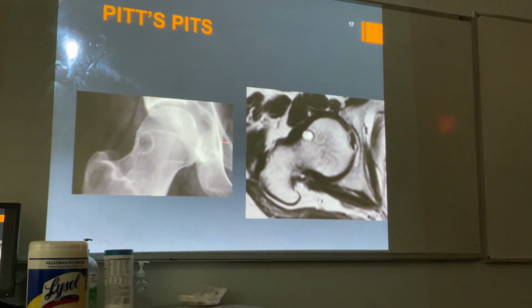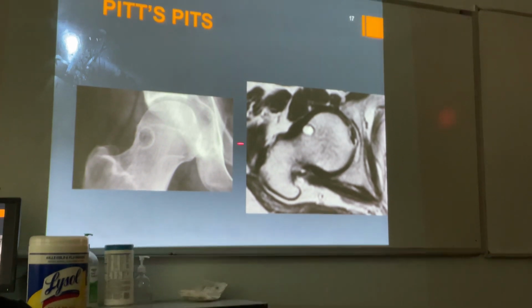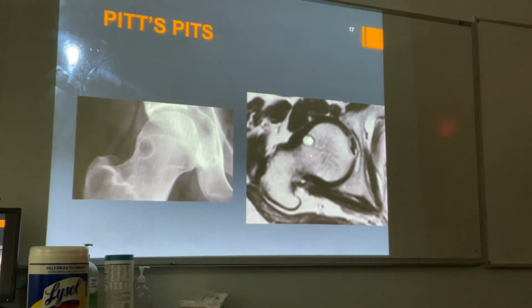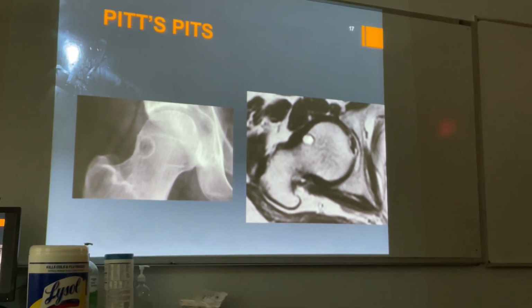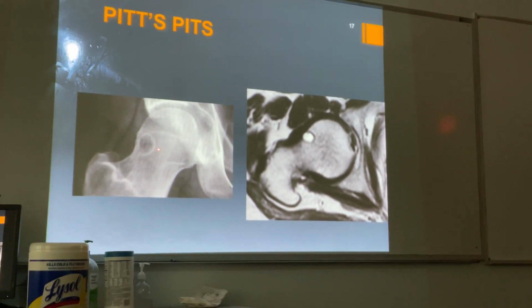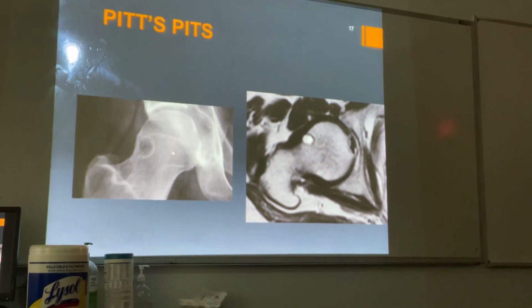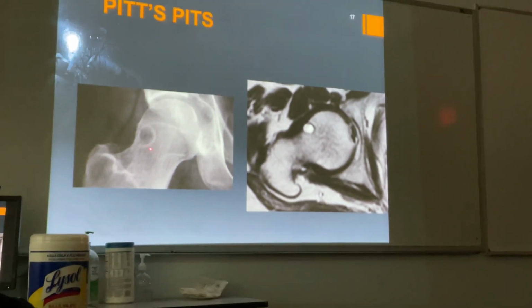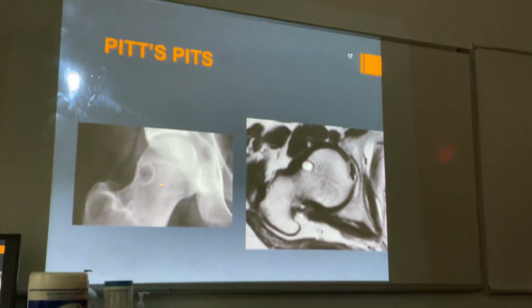So plain film, two different patients, but for purposes of what I want to describe for the national boards, plain film. The advanced imaging and what kinds of decisions can you make? Small, medium, or large, unilateral or bilateral. I have also seen them as a little cluster of 3 or 4 of these, much smaller in the central portion of the femoral neck or on the medial side.